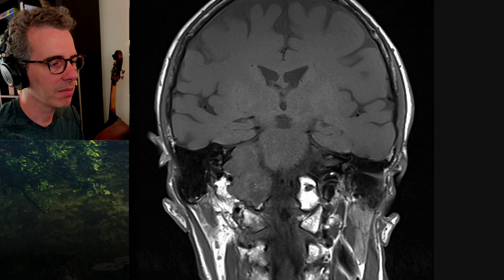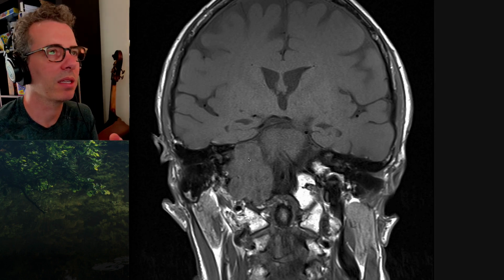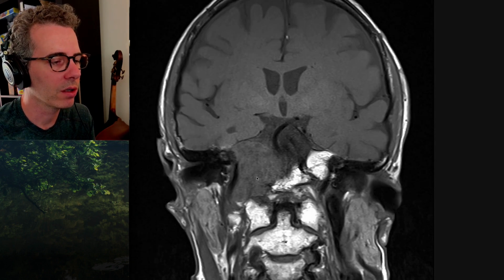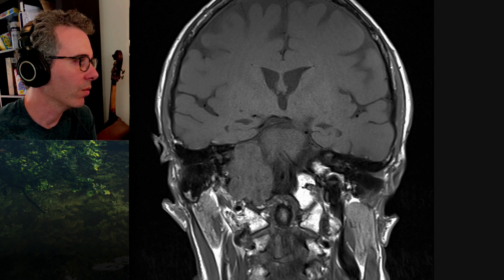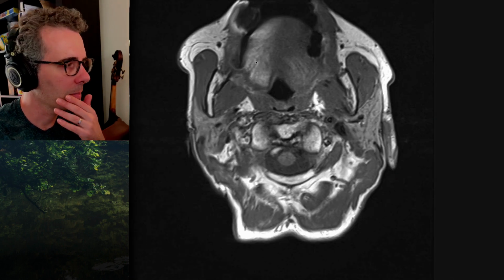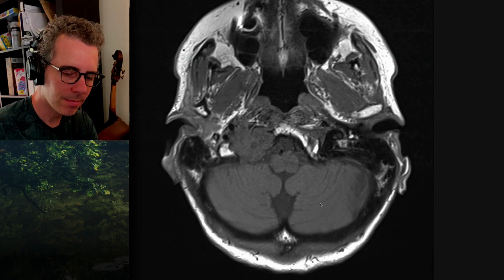So it's not really the petrous apex, the epicenter, which is up here. Doesn't mean this couldn't be a petrous apex mass. This just happens to have grown mostly inferiorly. But if you're going to use the epicenter idea, then this fits well with the hypoglossal, which also fits well with the fatty atrophy of the tongue. So schwannoma of the hypoglossal canal, of the hypoglossal nerve.